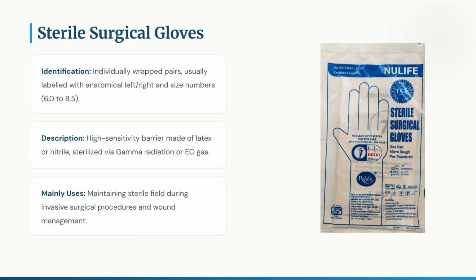Sterile surgical gloves are individually wrapped high-sensitivity barriers, typically made of latex or nitrile. Their main use is maintaining a sterile field during invasive surgical procedures and wound management.